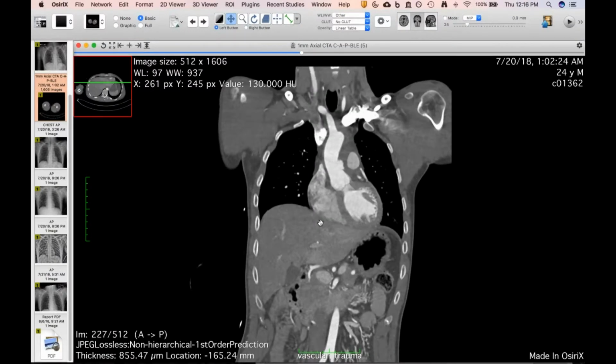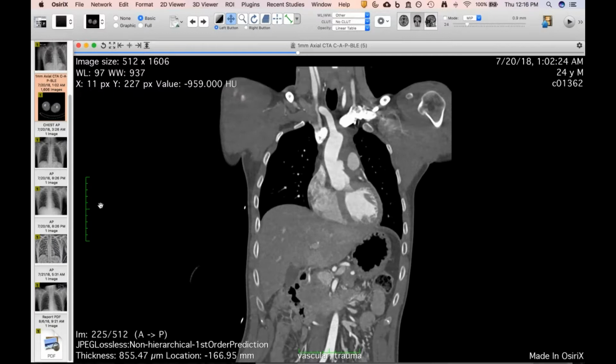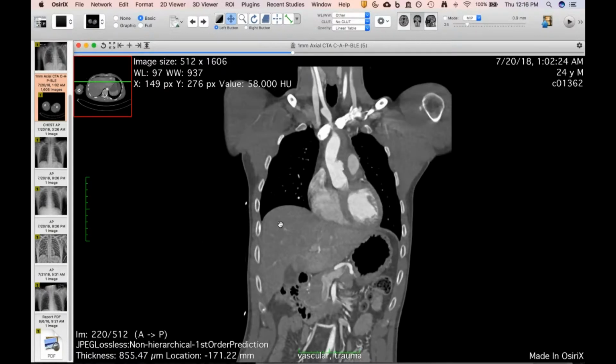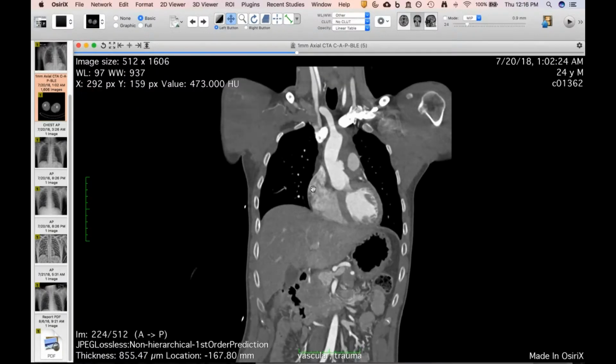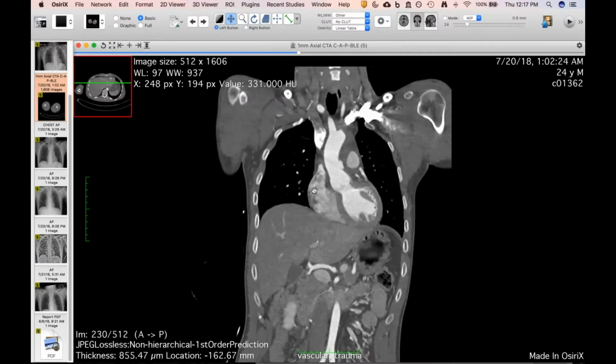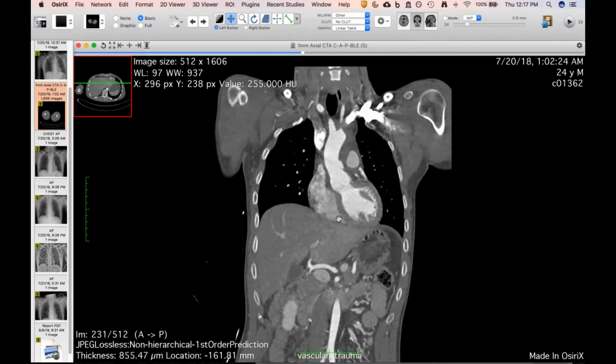They waited a week? Well, you must have some really, I mean, that's crazy. Yeah, they did a follow-up CT a couple days later. It was unchanged, and there was some question at the outside hospital. One of the surgeons looked at it and thought maybe there's some motion there, and we were like, no, that's nonsense. This is clearly traumatic aortic injury. It's just in an unusual location.